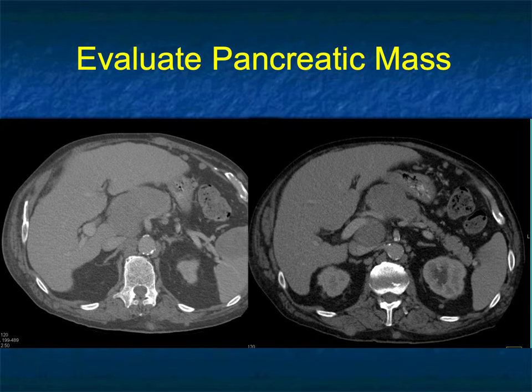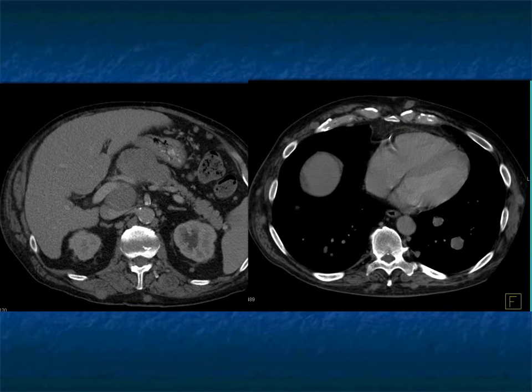Another case, mass sent for pancreatic cancer. You see cirrhosis, you see a mass in the region of the head of the pancreas, but there's no common or intrahepatic duct dilatation or pancreatic duct dilatation. There are then nodes in the portal caval space, and if you look hard, there are nodules in the subcutaneous tissues. So this really isn't a primary pancreatic adenocarcinoma. Could it be lymphoma? I guess that's a thought. Soft tissue nodules, bulky adenopathy, large mass without duct dilatation.